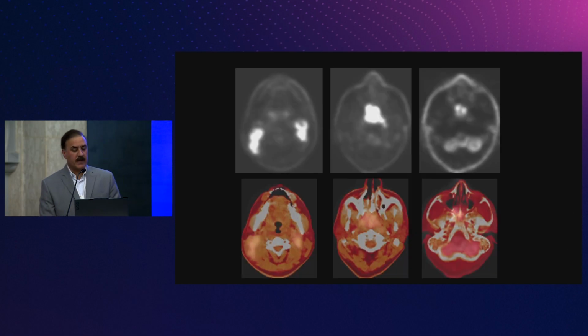A PET scan was obtained on this patient, and there was nothing in the clivus. So really, it's food for thought: are we calling it more than we should be with involvement of the bone in these cancers?